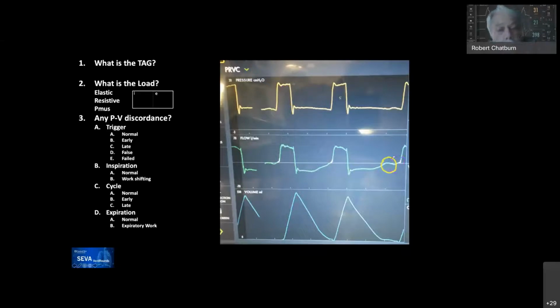On the other hand, the peak expiratory flow is driven by the plateau pressure minus PEEP. If this patient was passive, you'd see exactly the same peak inspiratory flow as peak expiratory flow. You don't see that here, so something else is happening. The driving pressure for expiratory flow is being offset by the patient's continued inspiratory effort. That's the way I would look at that. I can't think of any other explanation for that. Oh, I like that explanation.